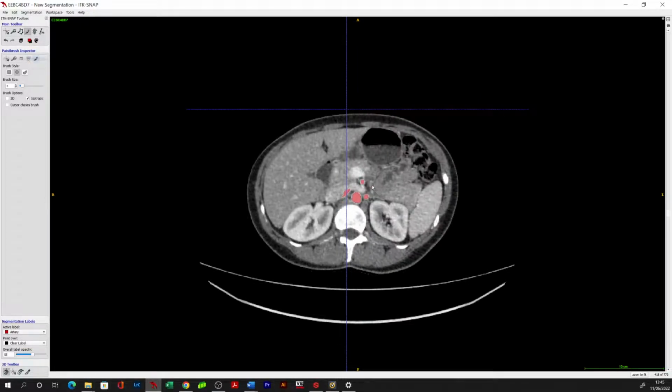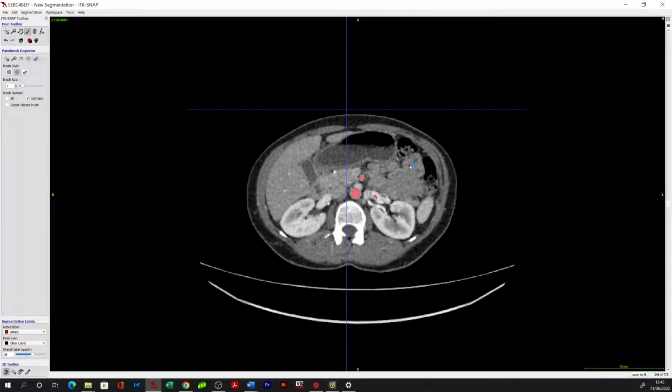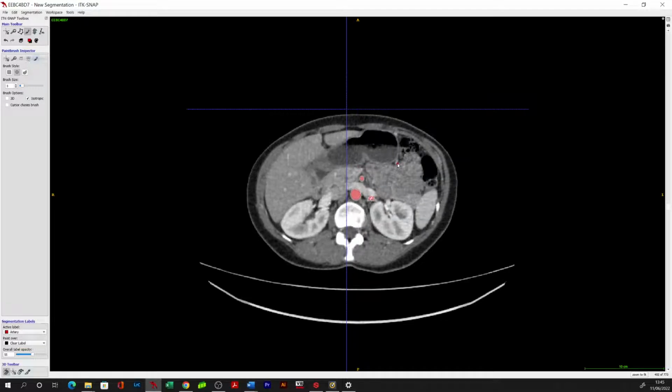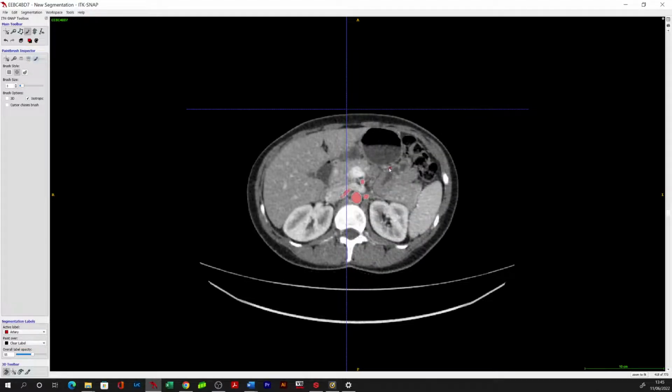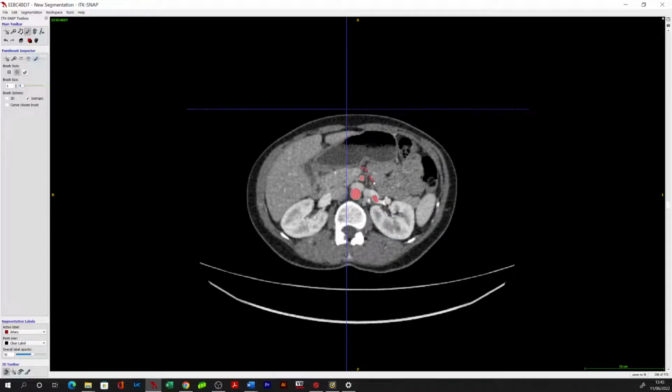Follow this. Where is this going? So I think you've actually got a kind of trifurcation. This little artery here, you can follow it as it courses back towards here, which is all part. So this will be a kind of more left-sided branch.